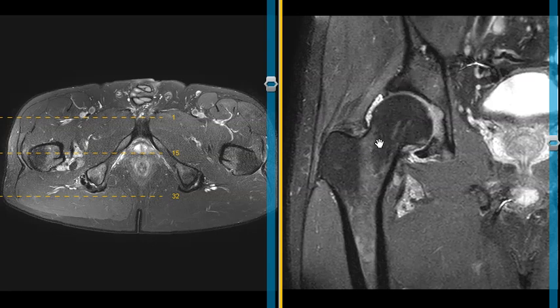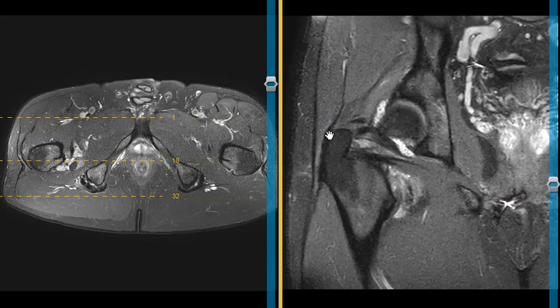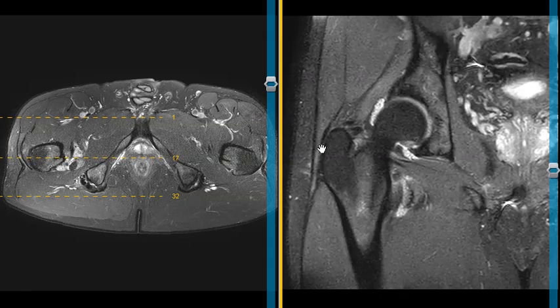We see the neck here, and we see a bony protuberance out here. This is the greater trochanter. And when patients have trochanteric bursitis, almost always it's associated with the gluteus muscle attachments right here on the greater trochanter. So we see fluid or inflammation over here, and these are the gluteus muscles, the butt muscles coming down here and attaching over here, but this looks pristine. There's no fluid or inflammation in the region of the greater trochanter.